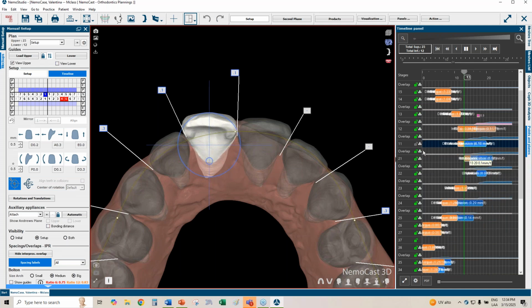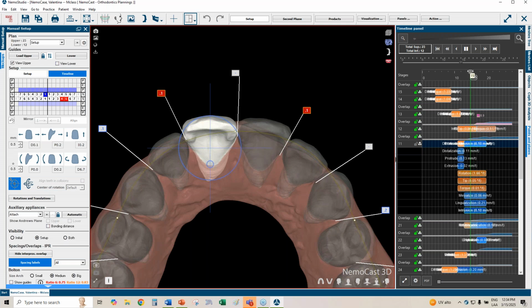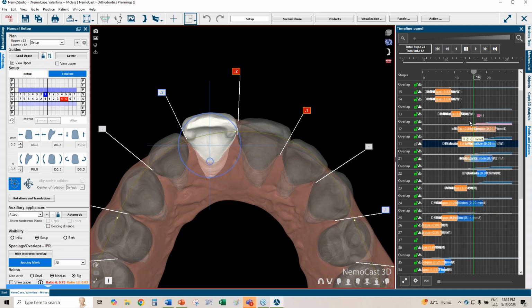And it will add all the necessary movements to perform this situation. And now afterwards, where the movement starts happening, I will have a better condition. Okay, so I actually can move the lingual situation right here a little bit later. And this will work far better, right?